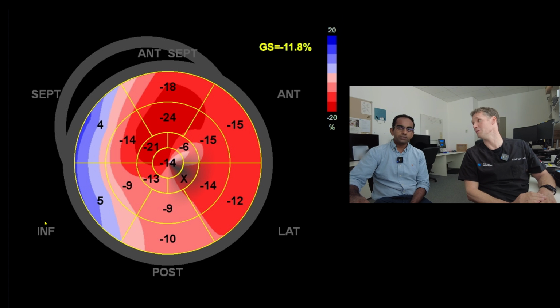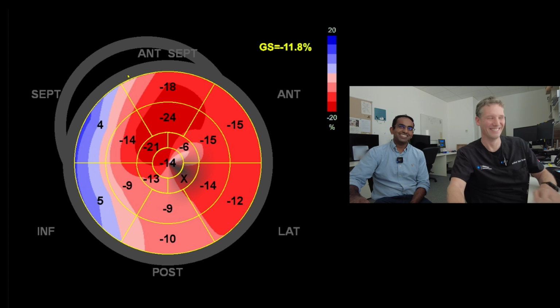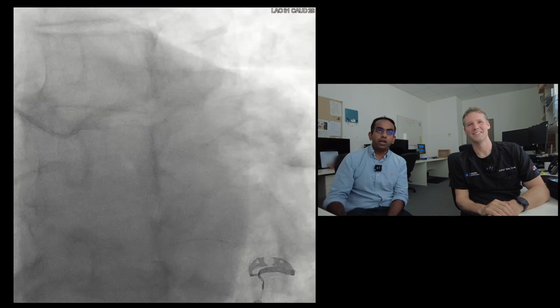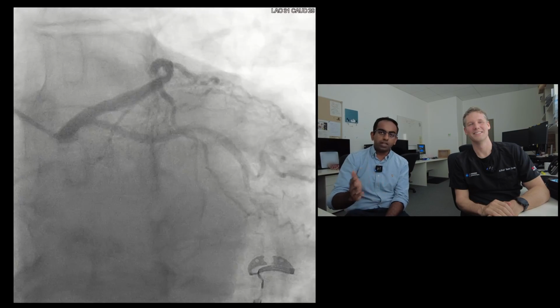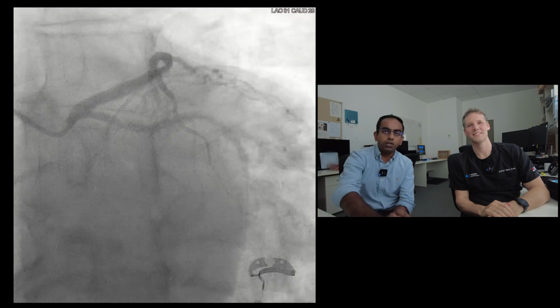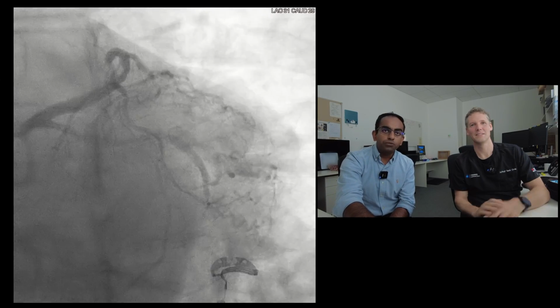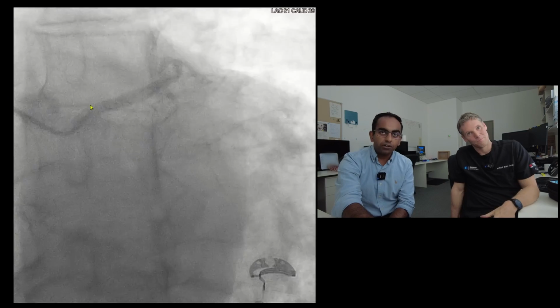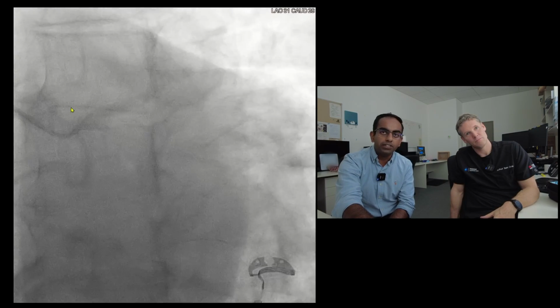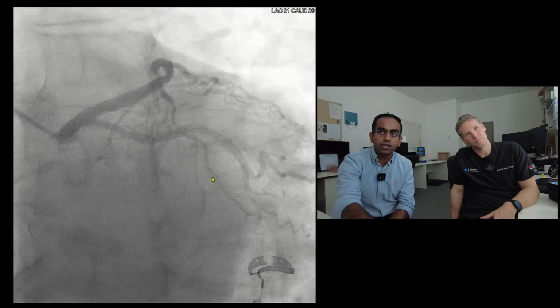Shall I show you what you really want to see? Sure. So this is an angiogram of this patient. Obviously, this patient was brought up as a STEMI call, whatever day and time it was. You've got what's called a Tiger catheter, and the LAD is coming off at the top, and the circumflex is coming down.